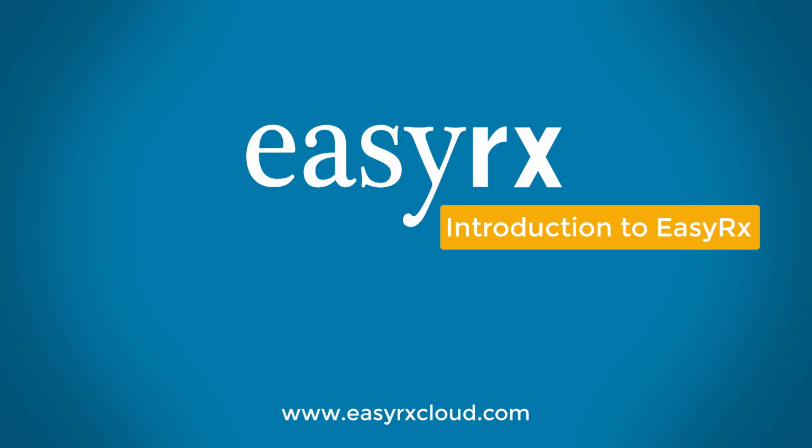Hello, and welcome to this introduction and overview of EasyRx. In this video, we're going to show you an overview of EasyRx and really what the Universal Lab Prescription digital workflow and 3D software platform means for your practice and for your labs.